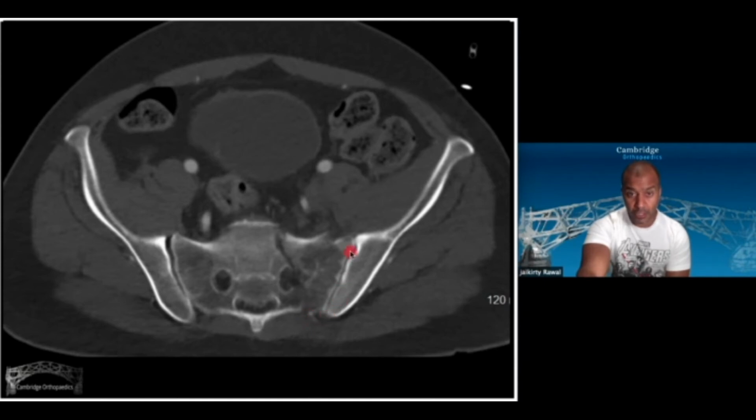There's more. There's more. Let's look at this SI joint. This SI joint looks normal and closed. Compare it on this beautiful axial CT slice to this side, and this side looks different. So your suspicions should be that this is an LC3 type pattern of injury, i.e. one side has had compression, which had an arrow, and the other side has gone into external rotation.